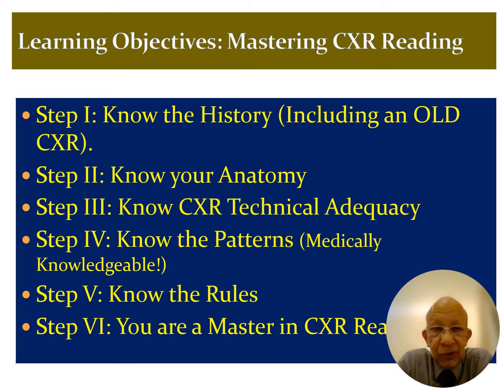Now, for this presentation, this is the roadmap that we're going to go through. If you master these 5 steps, or you're aware of these 5 steps, then you will confidently read and interpret chest X-rays. The first step is knowing the history, and that includes an old chest X-ray. Never attempt to read a chest X-ray without having some clinical data about the patient, and having a look at an older chest X-ray if it's at all available.